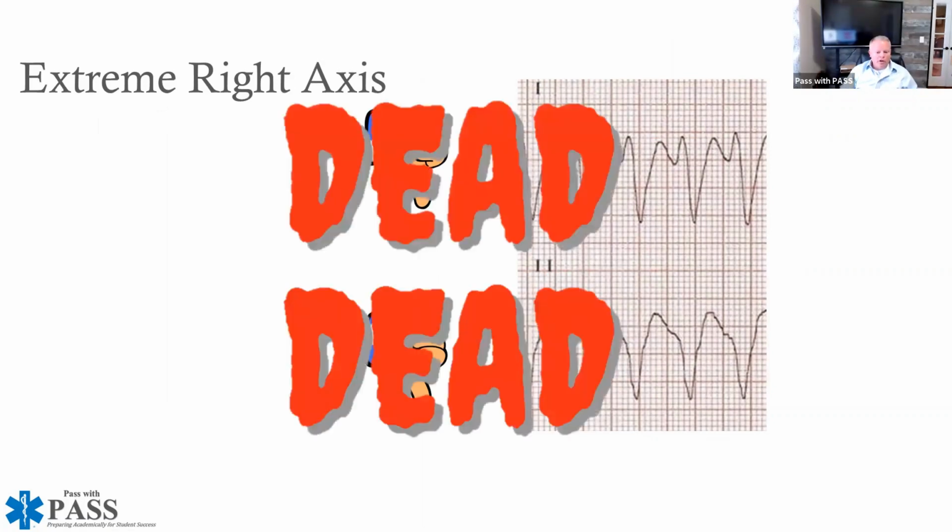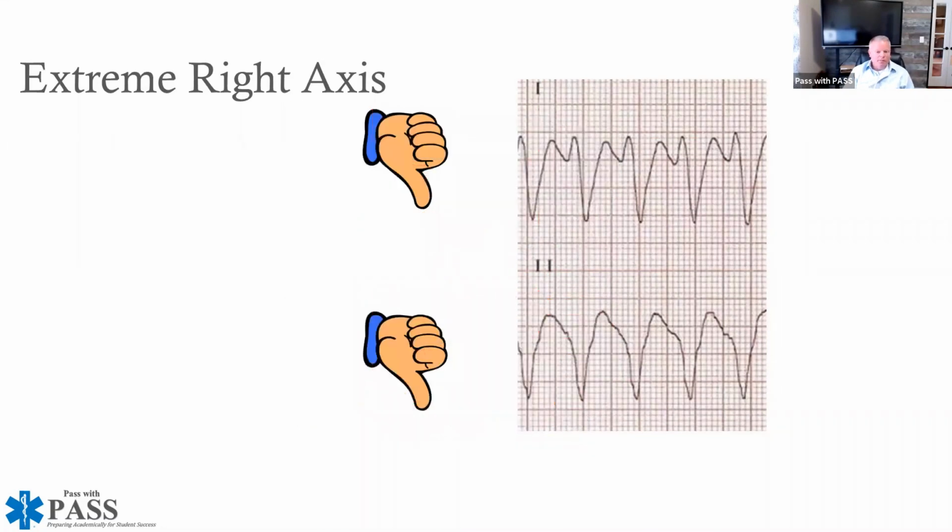So, if you look, I'm going to kind of back up here just for a second to clear the image up. If you look in lead 2, what would you guys call that? That is a monomorphic ventricular tachycardia. So mono meaning one, so they look the same, okay? Polymorphic, poly means many. For those of you that don't typically read EKGs, polymorphic VTAC means that it has many variations. Monomorphic VTAC means that it looks the same, and this looks the same.